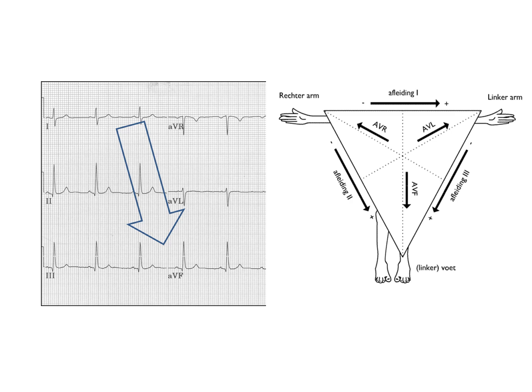To answer where it's going in the vertical plane, let's look at lead 2 versus AVL. Lead 2 is strongly positive, lead AVL is mostly negative, which means the electricity is going down and a little bit to the left, which would very much agree with where lead 2 wants you to go. Lead AVL's slight positive deflection is caused by the horizontal component, by the slight leftwards deflection of where the electricity is going, and the negative charge is caused by the fact that the electricity is going down when AVL wants you to go up.